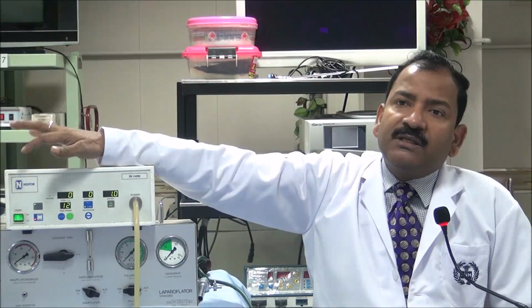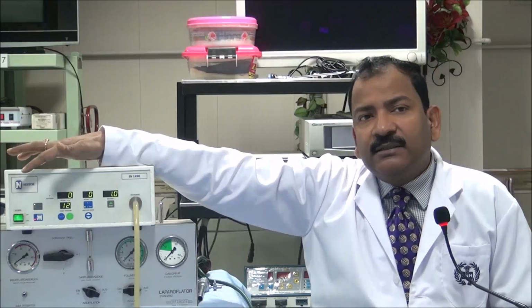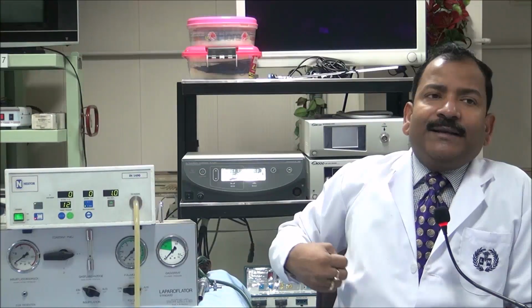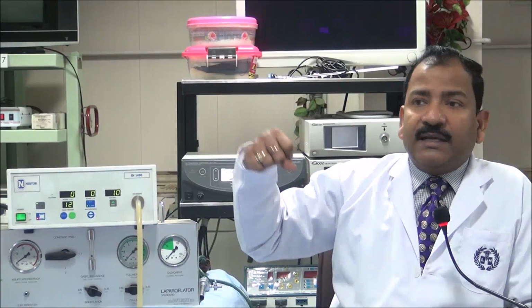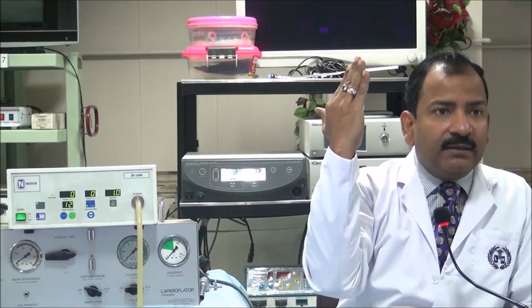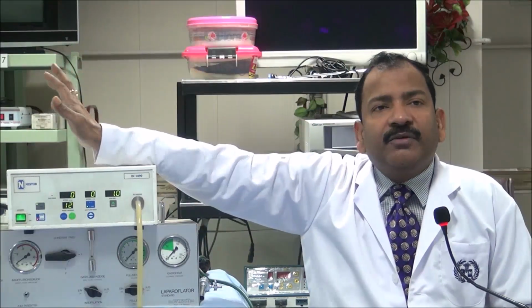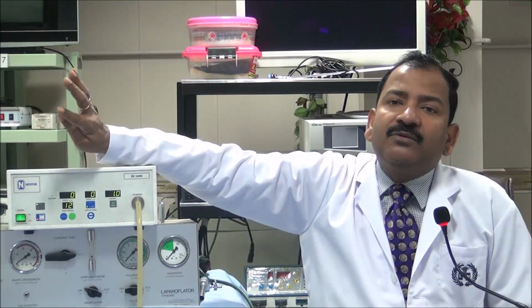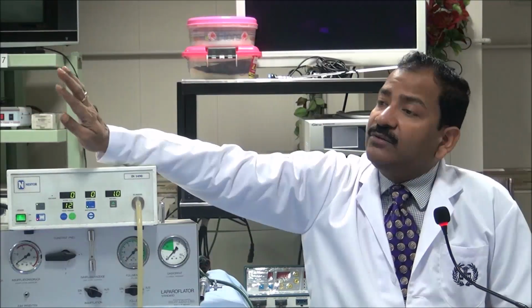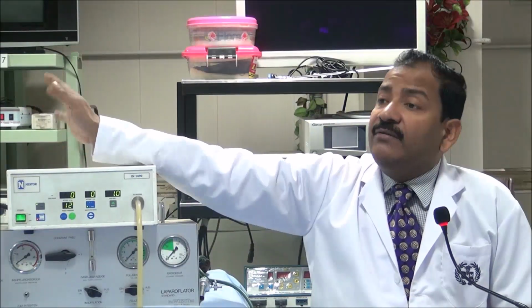Another patient comes, a 70-year-old grand multipara woman. In that also, within 100 ml, liver dullness obliterates. There also, because this is the potential space, gas always reaches this space first. That's why in perforation you do an X-ray in erect posture, so it will be up. But within 600 to 800 ml, pressure will reach 1, 2. After 1 liter it will come to 3, 4. After 2 liters it will come to 6, 7. After 3 liters it will come to 10, 11. After 4 liters it will come to 12.